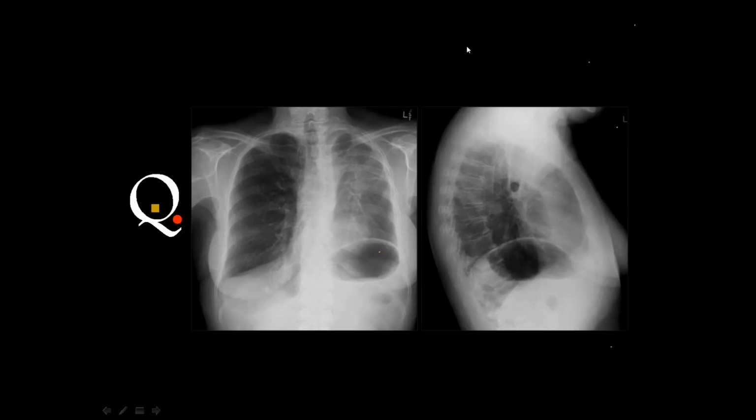The hernia, right upper lobe collapse, left mastectomy here. Okay. Then if you look here, you see that the diaphragm is elevated and the left hemithorax is somewhat opaque. If you look at the lateral view, you see that the opacity is projected anteriorly, and you can know that the opacity is anterior from the silhouette sign with the cardiac shadow.